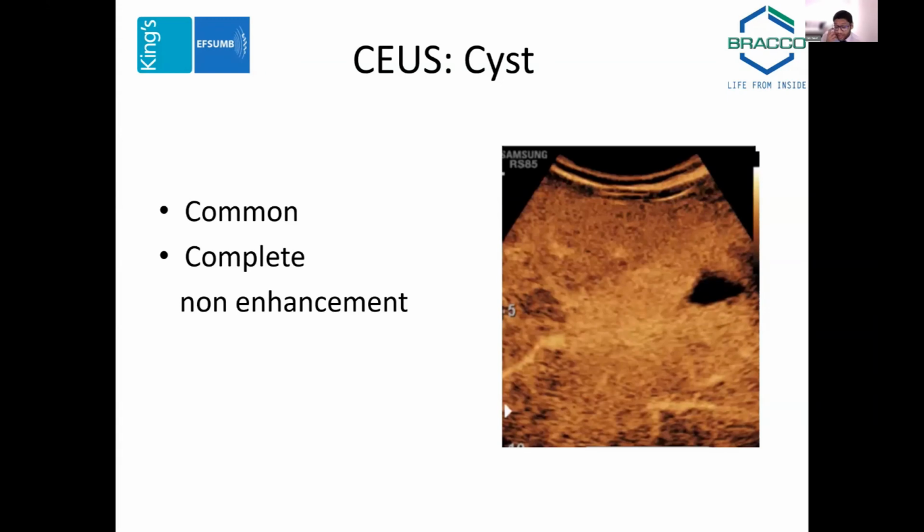Cysts, these are very common. They're the commonest incidentally discovered focal liver lesion. And we dismiss them because normally they are simple cysts. They're clearly anechoic. They've got no Doppler signal. They've got through transmission. And very rarely do you need to do a contrast enhanced ultrasound.